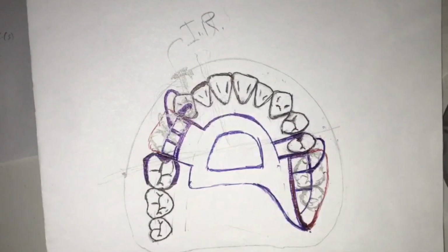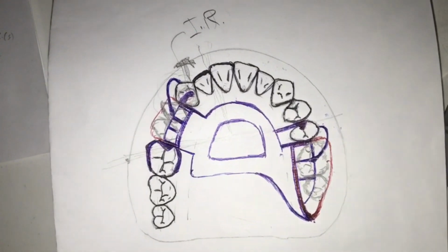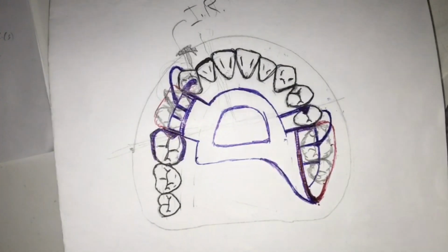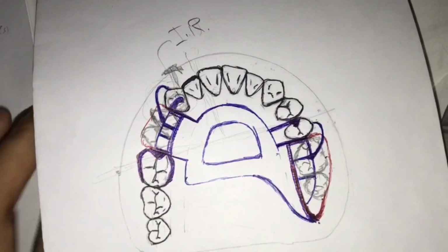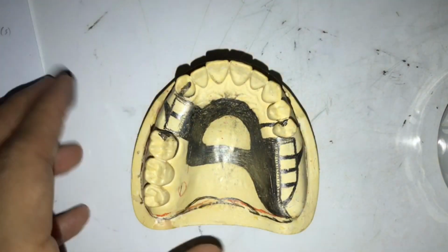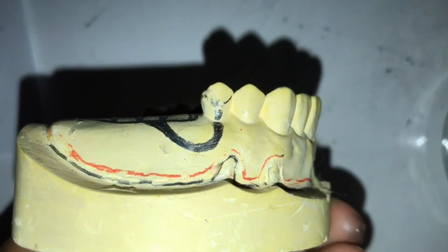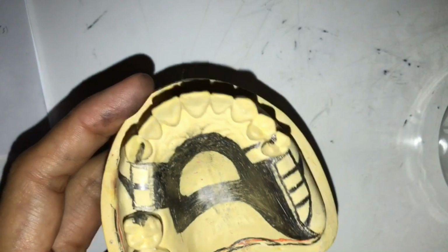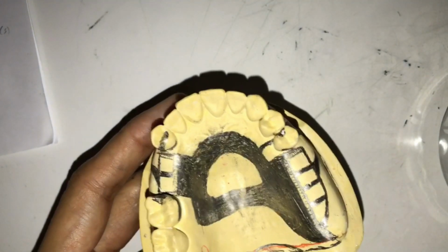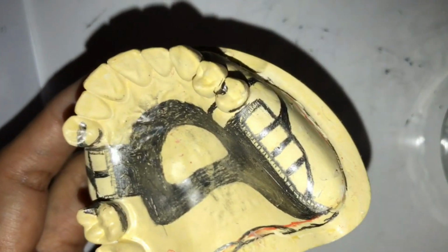Okay. Alright. So this is the other one that we have discussed a while ago. If you would like to compare it in a cast, it's going to be a lot different. This is the 2D form and this is the 3D form. Drawing on the cast would entail much more technique, because we are going to follow some of the design principles already, as if simulating the wax. So we're going to learn this step by step.